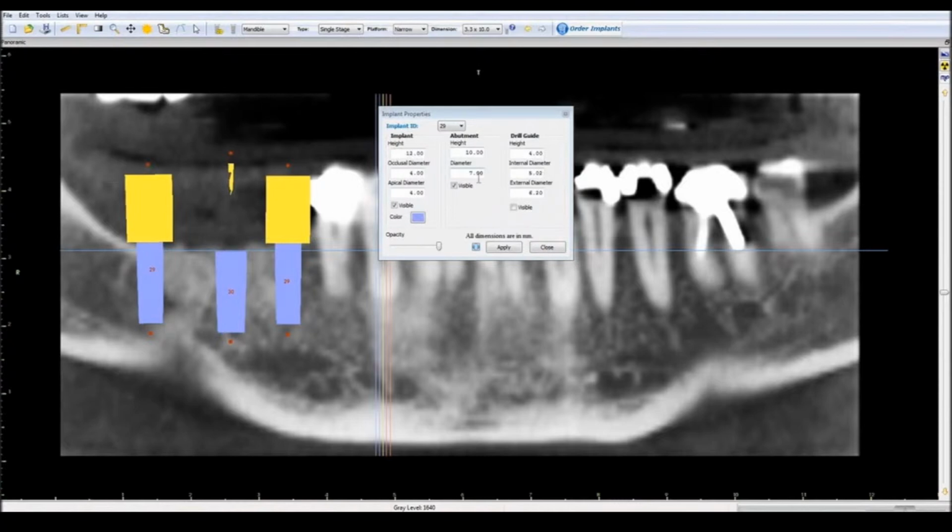Now this next tooth is going to be a molar, and again, restorative driven. I now declare that molar to be 10 millimeters. Now if I bring this molar in contact or approximate to the second bicuspid implant abutment, the spacing between these 2 implants will be precise because each implant is centered on the future tooth.